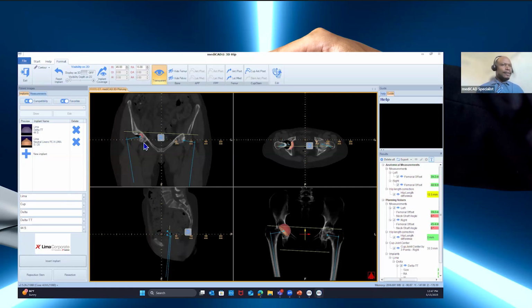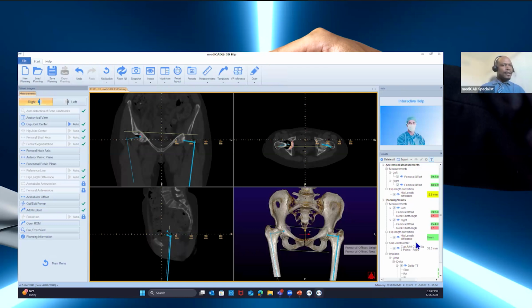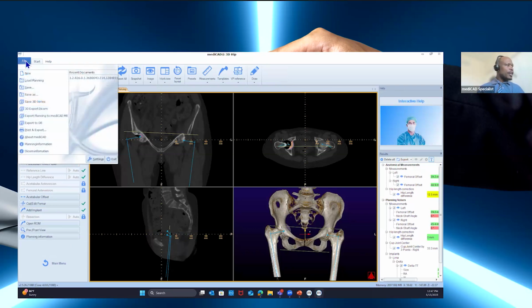So now that that is done, I can click again. I'm not going to add the storm. It's just so you can see. You just have to click export. You can export it to CSV, XML, or text to be able to export the plan. Or you click here, export to the operation room, print or export. You just click to print or export.